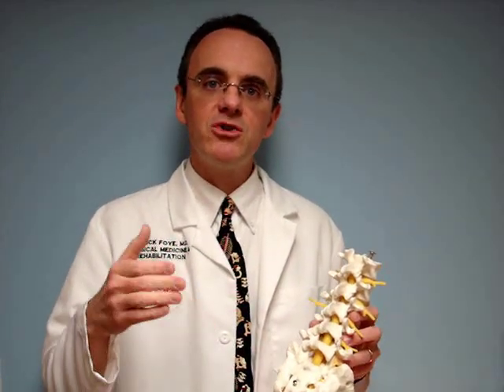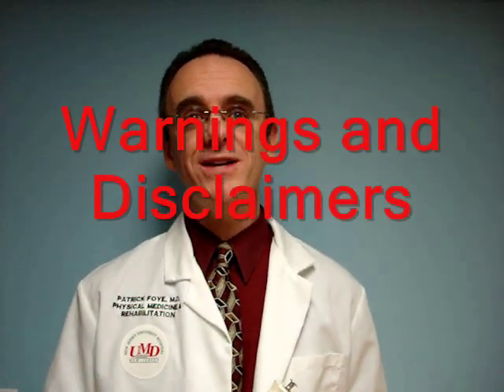So really, hopefully by taking those steps, by looking carefully at the radiology orders, the MRI orders, by looking carefully at the official radiologist's report, the typed up report, and by looking at the actual images, you and your doctor can make sure that if you're having an MRI done because of tailbone pain, it should of course actually include the tailbone. If you want, you can look at more images of tailbone MRIs at our website, which is www.tailbonedoctor.com.